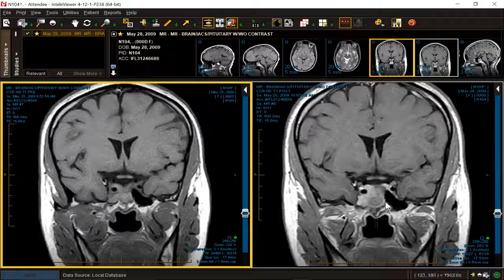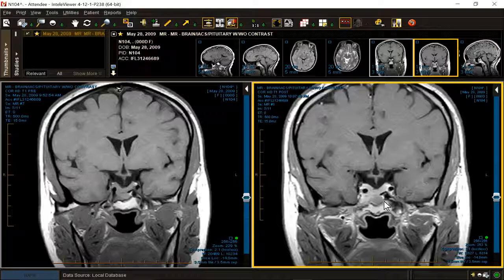So if you get into the wrong side, you are in huge trouble. And when assessing a lesion like this, it is said that somewhere between 180 and more commonly 270 degrees of circumscription of the carotid artery is a sign of cavernous sinus invasion.